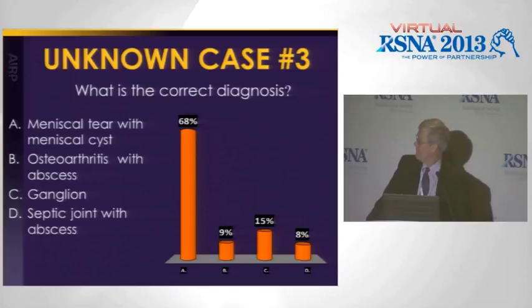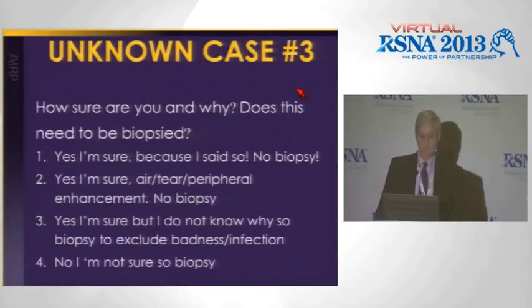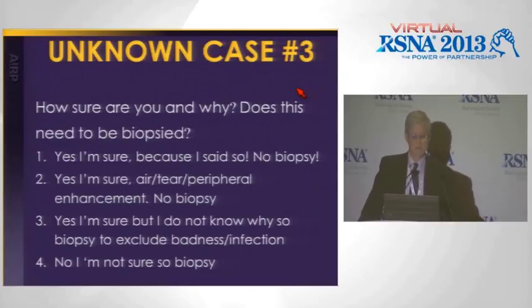All right, great. The vast majority of people got this correct. Two-thirds, this is a meniscal tear with a meniscal cyst. But there's a follow-up question. How sure are you, and why? Or does this need to be biopsied?